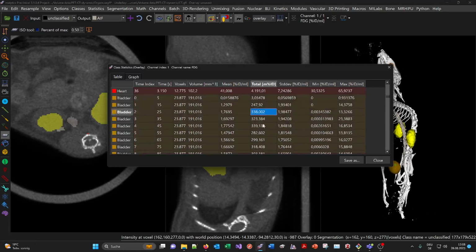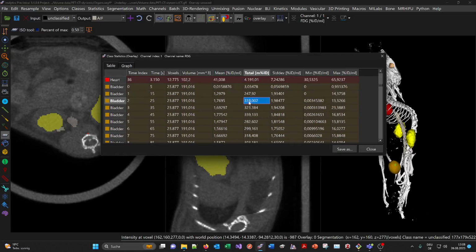These numbers here, by the way, are in German notation, so the comma is actually a decimal point, and it'll use a decimal point if you use it with the English settings of the operating system.